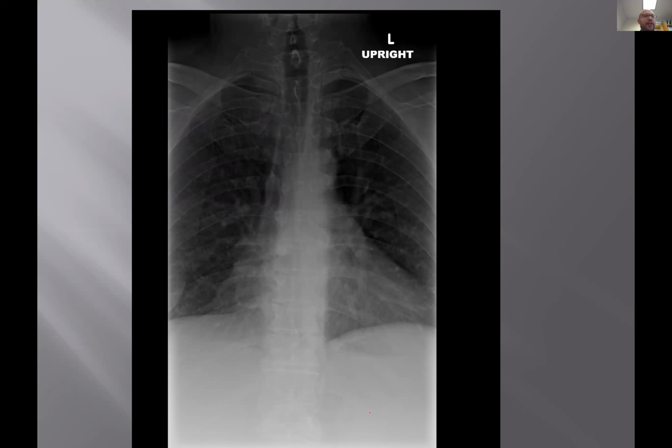All right, you had a few seconds to look. Anybody want to start throwing some stuff out there? Right lower lobe of the lung there, you got an air fluid level. Okay, let me just put this up here. I'm going to say this is the patient's left, this is the patient's right. So are you still wanting right lower lobe or left lower lobe?